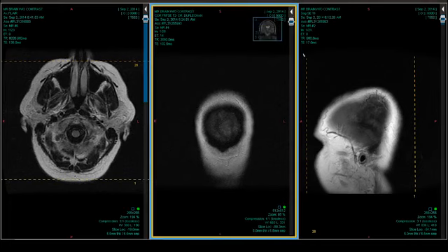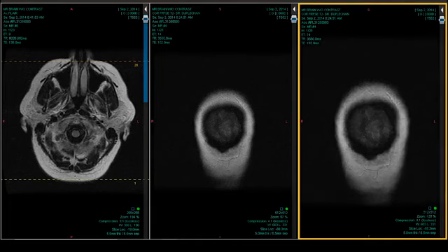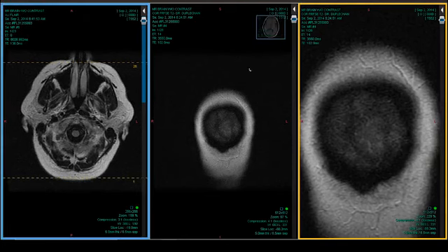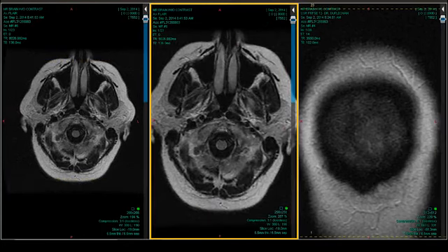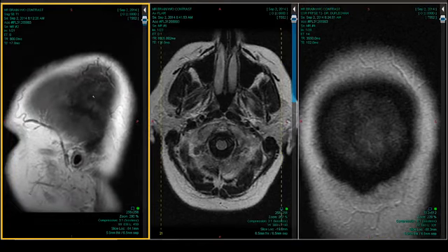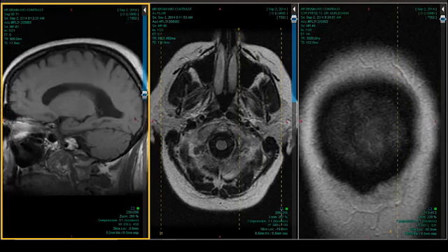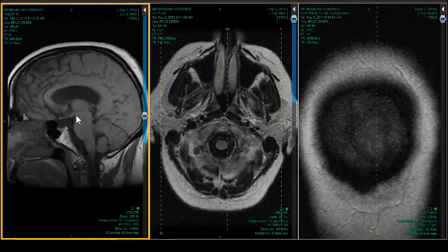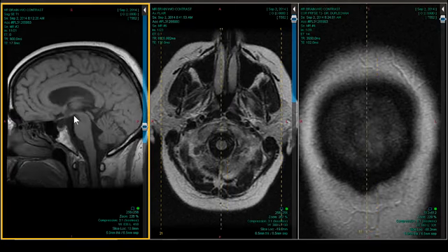So I'm going to stay with the theme of trying to get up at least one coronal image to start, one axial. I usually like to have the FLAIR up first, and a sagittal so we can get a good look at the cerebellum, the brainstem, the midbrain, the pons, and the collicular apparatus. And this one, the superior collicular apparatus, is probably a little small, although the mammillary body, not so much.